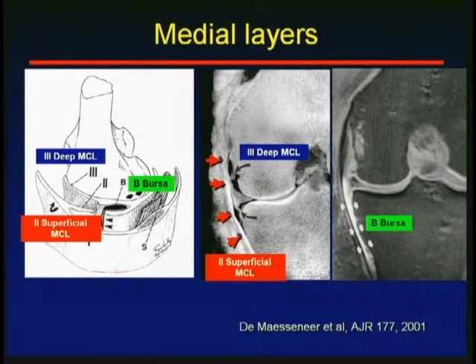It's not always pathologic. Little bits of fluid in this bursa are often seen in patients who have osteoarthrosis and are presumably asymptomatic. Larger collections can be associated with symptoms. They're particularly common in patients who have underlying inflammatory arthropathies, but we often are not called on to image these structures. They're really diagnosed on a clinical basis and managed either conservatively or with anti-inflammatories or local steroid injection.